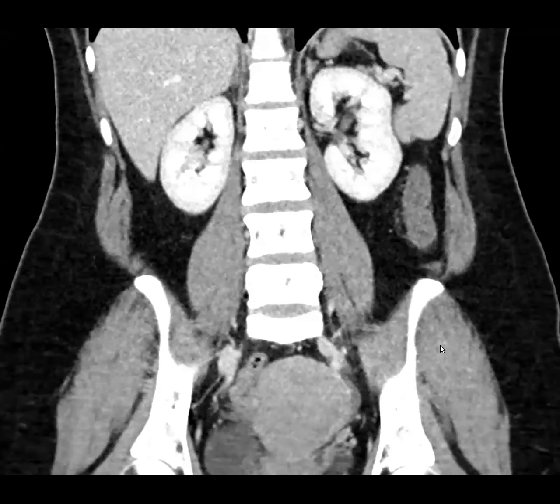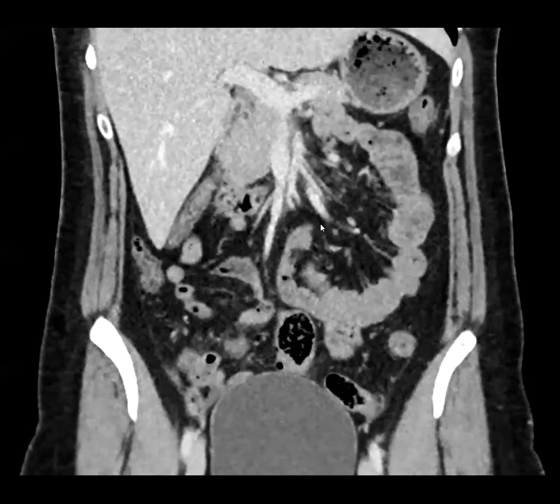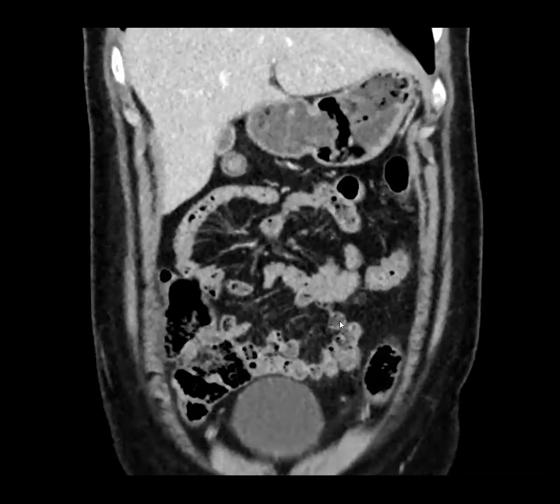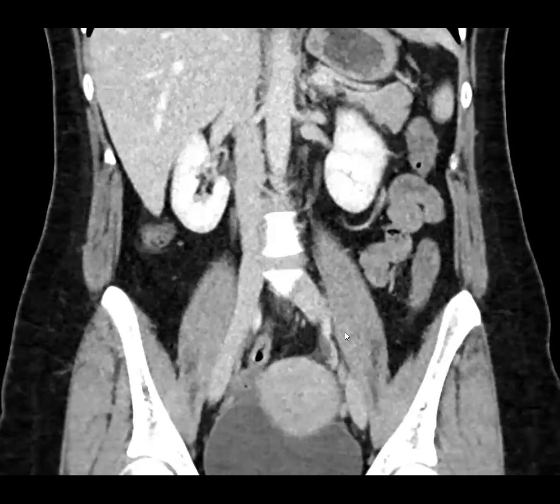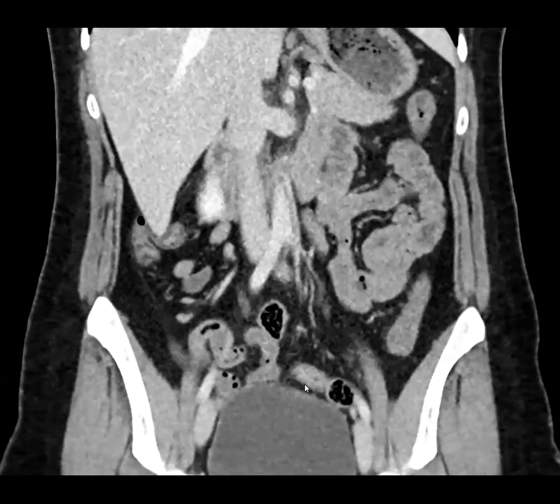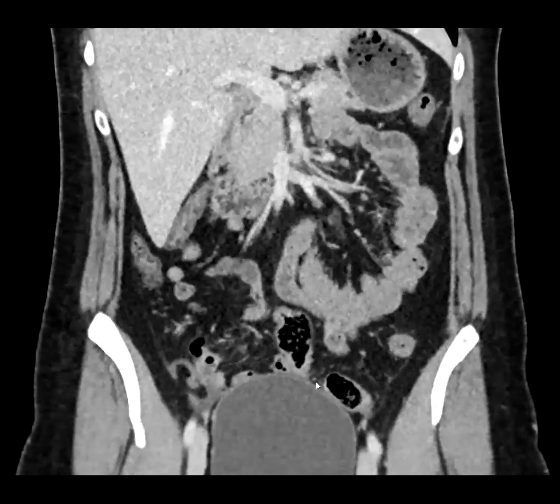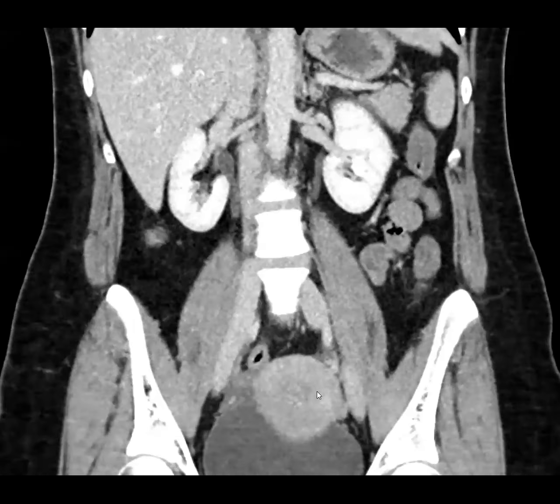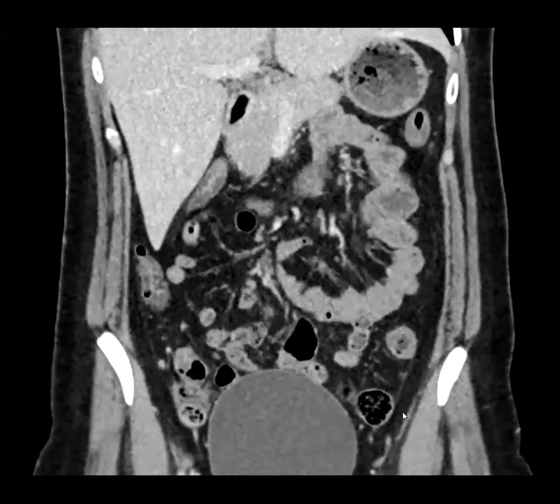Excellent. A lot of times we think young person, vessels are fine, they were an outpatient, whatever, this is probably not going to be ischemic, right? So we thought, okay, this is maybe an infectious colitis. We didn't see any other findings of inflammatory bowel disease, no small bowel involvement. And the person who read this happened to specifically say no evidence of ischemia, no pneumatosis, no abnormal enhancement of the wall.